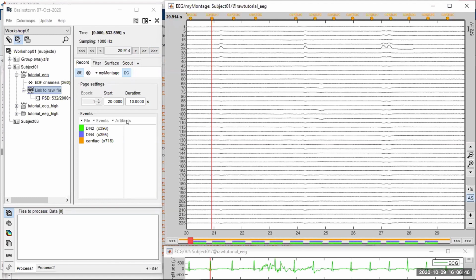So first of all, in order to do that, we do need some sort of an electrode that tracks the eye movement, right? So either an electrooculogram. If you have a vertical electrooculogram that tracks the eye, then you can easily detect when an eye movement occurred. But if you don't have it, that's also okay, because we have electrodes that are very close to the eyes, and you can use these in order to detect eye blinks. So let me just show you how we're going to do this here. We do not have an EOG.